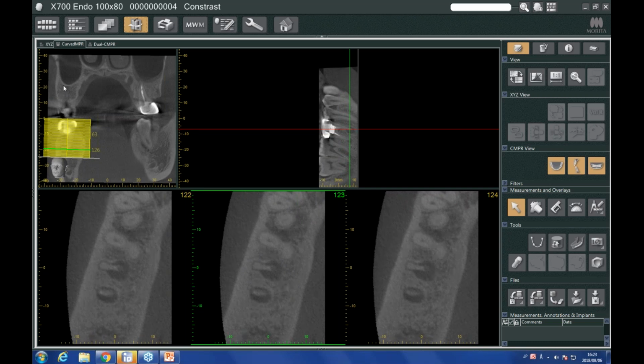If I was focused on just the dental arch view, then I wouldn't necessarily consider looking at it in this way. So what I want to encourage all of you to do when you're working with cone beam imagery and software that gives you this kind of freedom is to really make use of that, to make sure that you can see a tooth from every conceivable angle, because that is the power of 3D imaging.